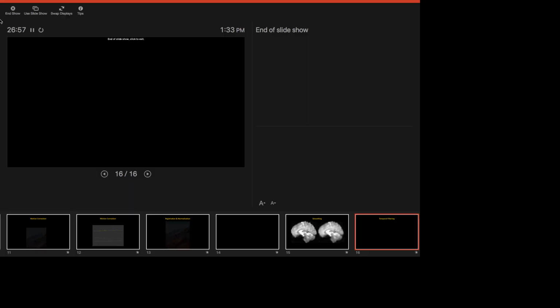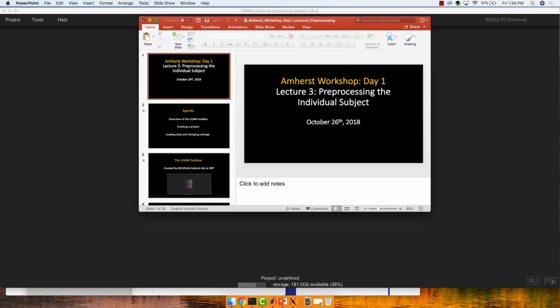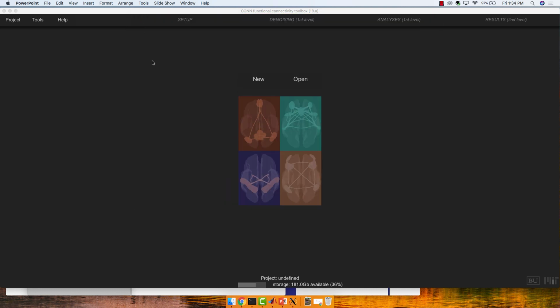Okay. So that all said, let's actually start to use some data. We're going to start this with only looking at a single subject and then build from there. Does anybody not have the single subject downloaded? Okay, then we're all good. Make sure you know where it is, because it may be in a slightly different location on my computer than your computer.